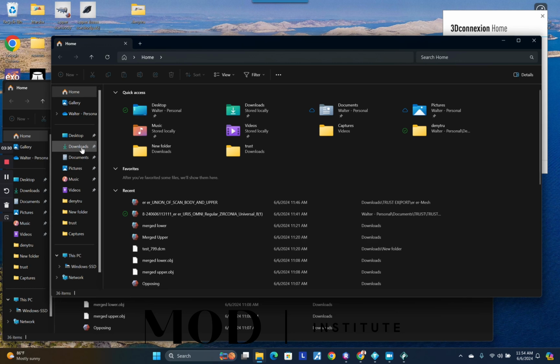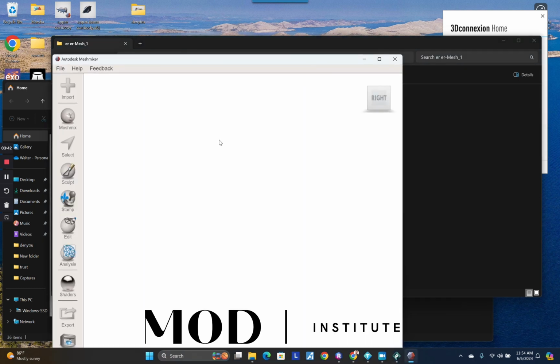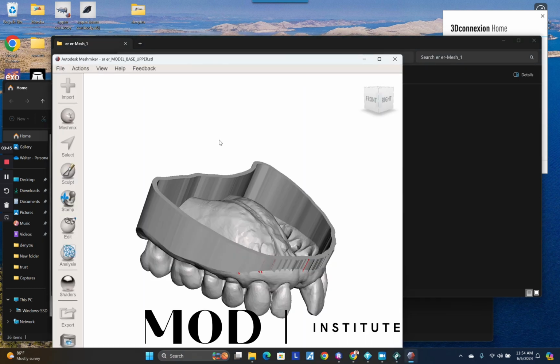And so now if we look at the files, let's see. Yep, so we should have all the files that we need. If we could take a look at them here, we have a solid kind of upper, or actually that's hollow. That wall thickness would be a little bit too thin for 3D printing. You risk fracture or warping. So remember, you want about 2 millimeter wall thickness for printing, and you could change that in the settings right there when we were designing that.